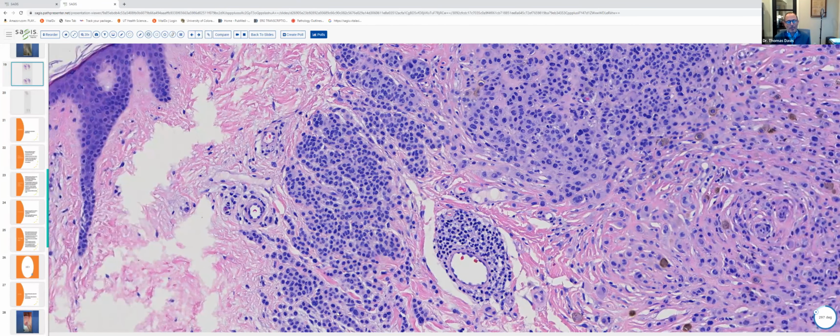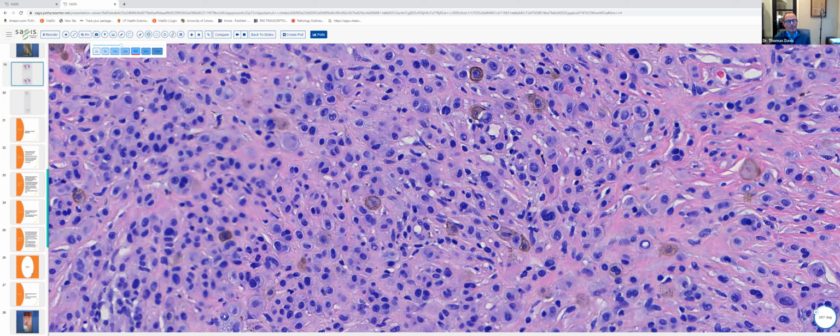These are very epithelioid. There's little, if any, maturation with depth or uneven maturation with depth. The nuclei are round to oval. A few are slightly hyperchromatic. Some of the cells are multinucleated. A few are pigmented, and yet there are no mitotic figures identified here or readily apparent.